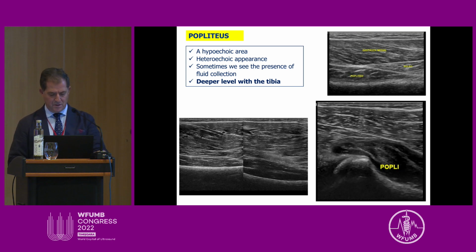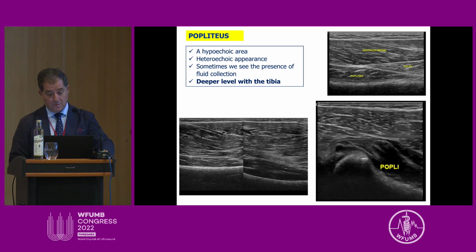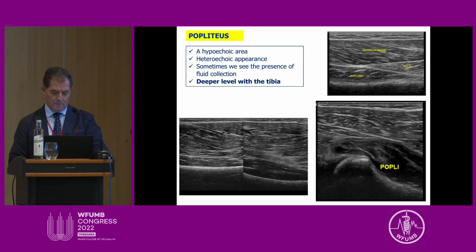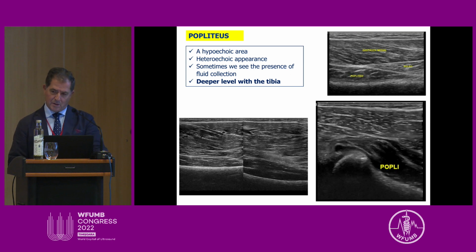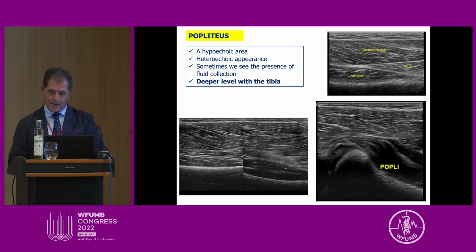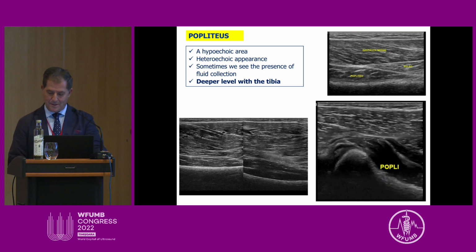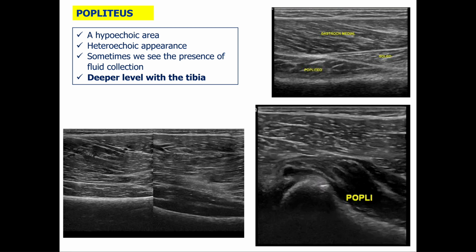This is the image. It is not frequent in this injury, but sometimes, especially when the patient feels pain in the posterior aspect of the knee, normally you think about osteoarthritis, or you think about a meniscus problem, but you forget the muscle, and it's very important to review.